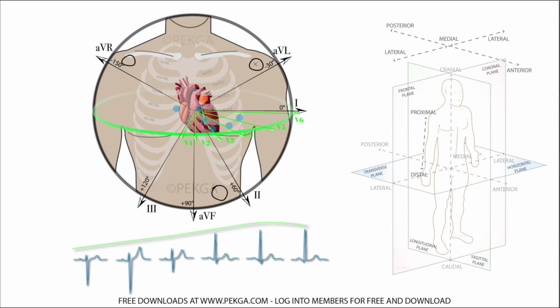In particular, here, you definitely want to check the lead that goes on the patient's left arm. It could be on the shoulder, it could be on the arm. Remember, you can move that. Also, the other ends of these bipolar leads are placed, one on the left leg, the other on the right arm. It also depends what kind of machine you have. You might have a fourth one down here, but I would check all of them, especially this one up here, right?